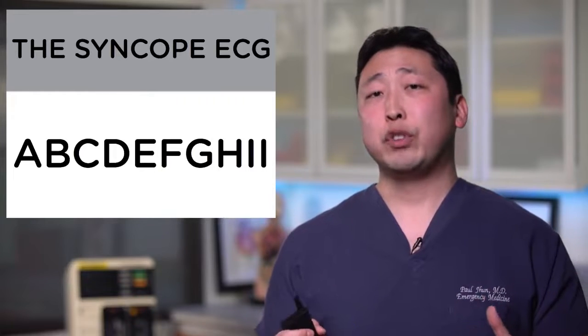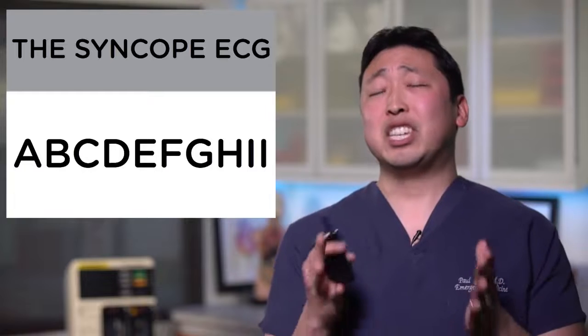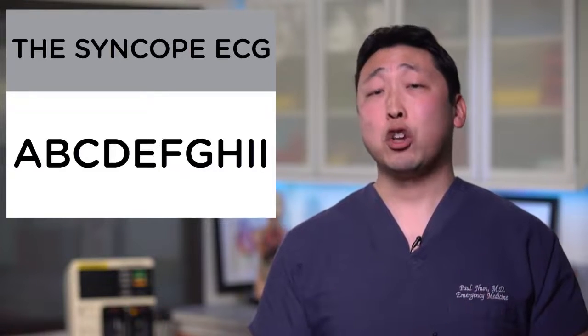H is for hypertrophy, left ventricular hypertrophy in a patient who otherwise shouldn't have it, especially the dagger-like Q waves that might suggest hypertrophic obstructive cardiomyopathy.